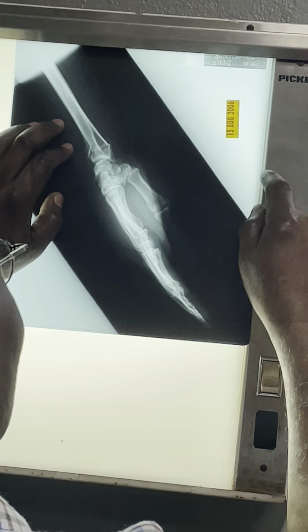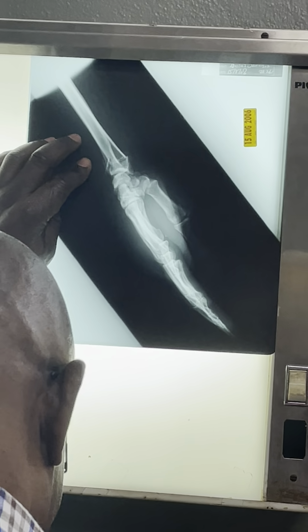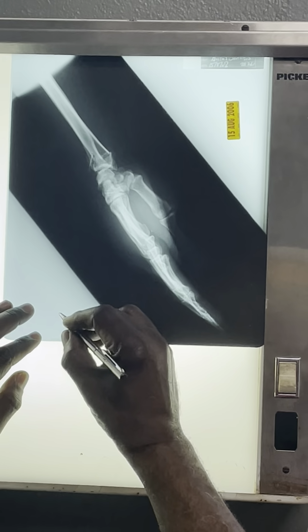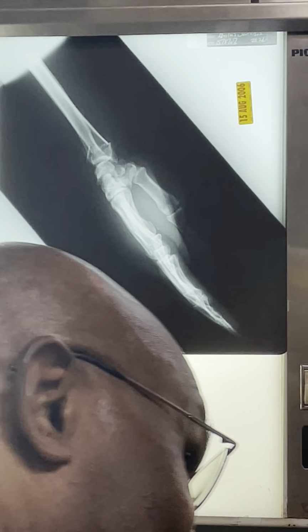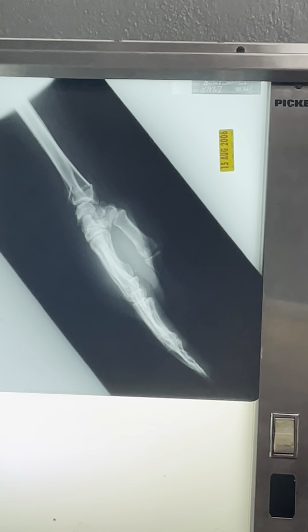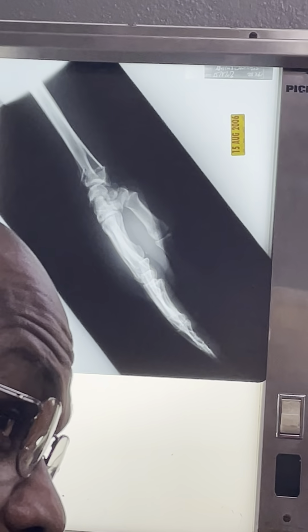So this is the anterior, right? You agree with that? That's the palm of the hand. This is the back of the hand. It's tilted towards the posterior. Remember we differentiated tilt and angulation. Bring the marker so we can show it. So tilted would be posteriorly, but if we use angulated, it will be anteriorly, because you can see the angle being formed. Direction.